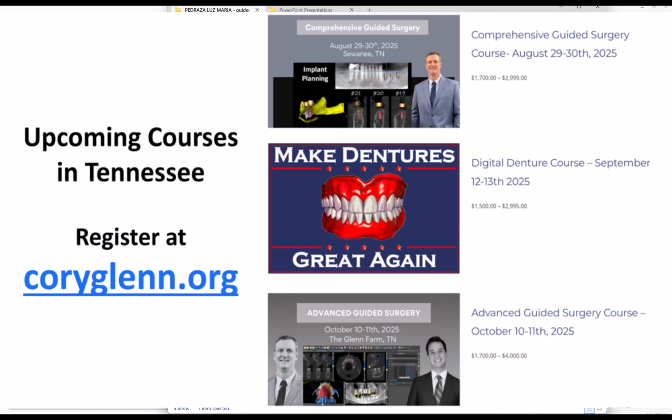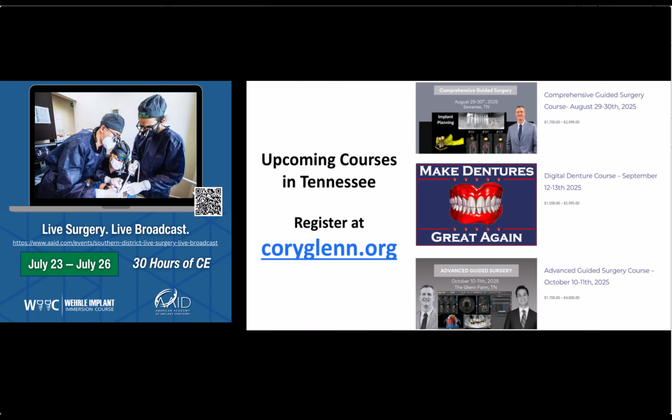But I haven't opened anything with this case, so you're going to see this from ground zero. What I'm told is it's going to be implants from 6 to 11 and basically get as many implants in there as we can. So we're going to have to do a wax up. We're going to use facial scans, all of that fun stuff that I always do for these cases. I'll try to do everything, so I think this will be useful to you.